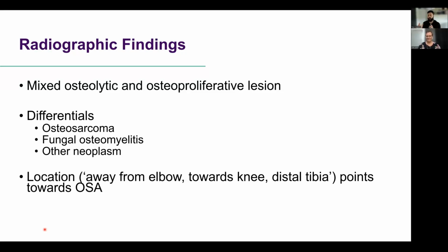So in this case, we've got distal tibia. That is a very common location for an osteosarcoma. So it, to me, is an osteosarc until proven otherwise. And how are we going to prove it? Well, that's where Dr. Baker comes in.